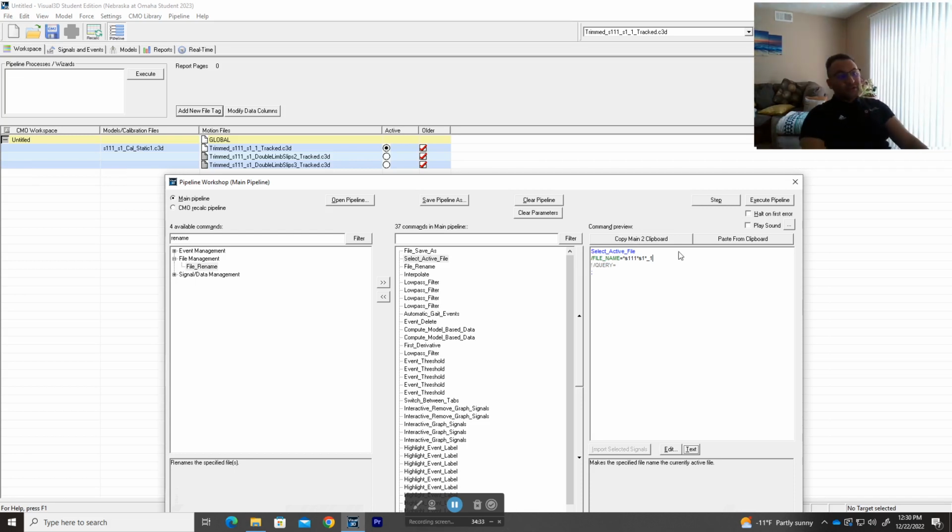It's very good because I'll show you later on, you can use a for loop in Visual 3D. So if you use a for loop and you want to, for example, only run specific trials and not analyze others, you never know what you can do later on and what you have to do, and when you feel cornered and only need to be efficient with a few trials, then you have this very powerful option.